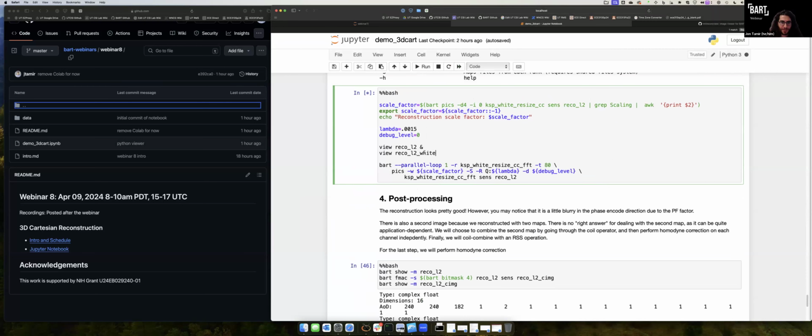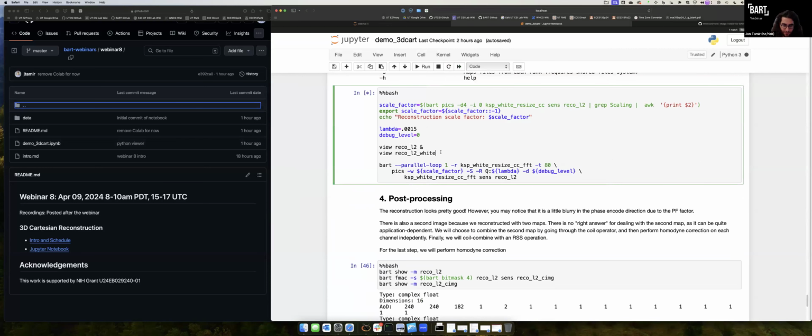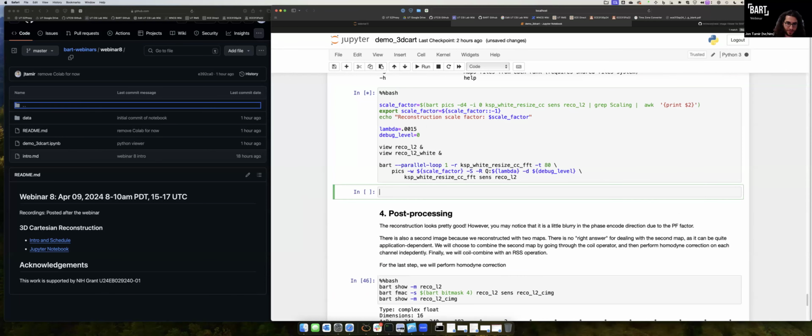Oh, no, sorry, I have to close this. I messed up here, just some bash messing up. Nothing actually dramatic.